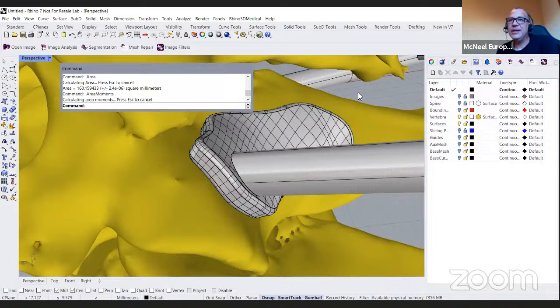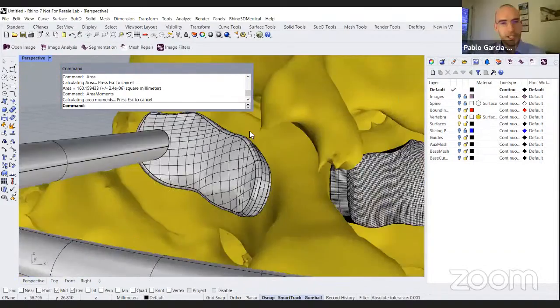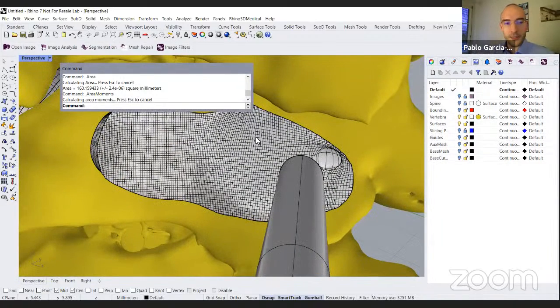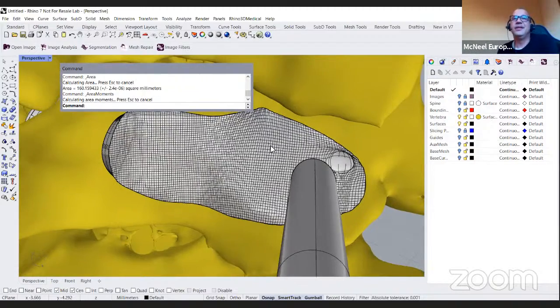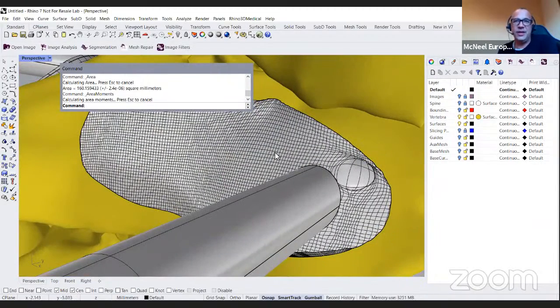Valeria Palacio says thanks, Pablo. I have a question: the command drape, is it a new tool from 3DMedical or directly from Rhino 7? No, that one is from Rhino. It's in Rhino 6 also. I think it existed even before, from Rhino 2 for sure. Probably it has been improved over the years, but basically it's a Rhino function.